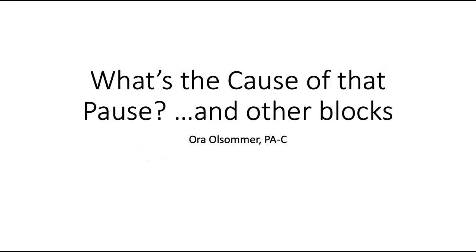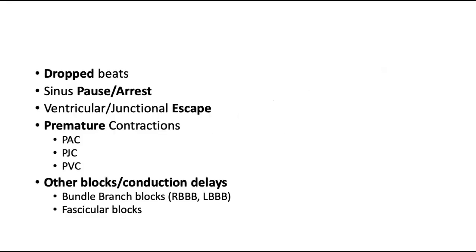Hi, this is some supplemental information for anyone who's having trouble with figuring out dropped beats, sinus pause or arrest, ventricular or junctional escape rhythms, or premature contractions. I'll also cover briefly blocks and conduction delays.